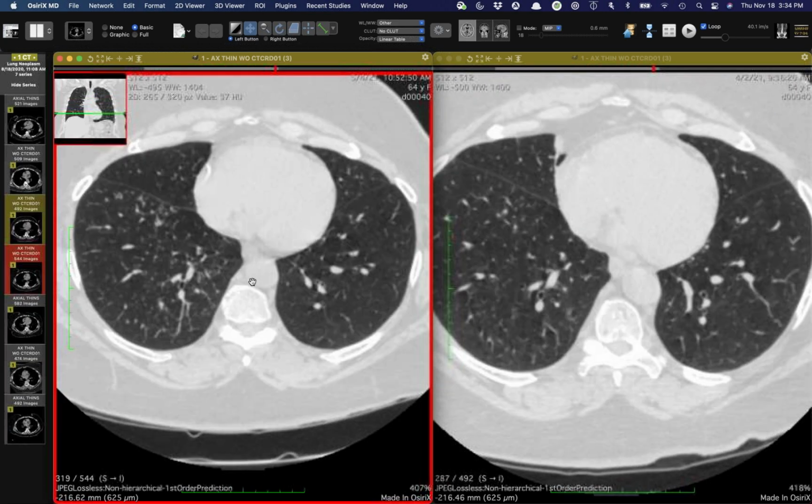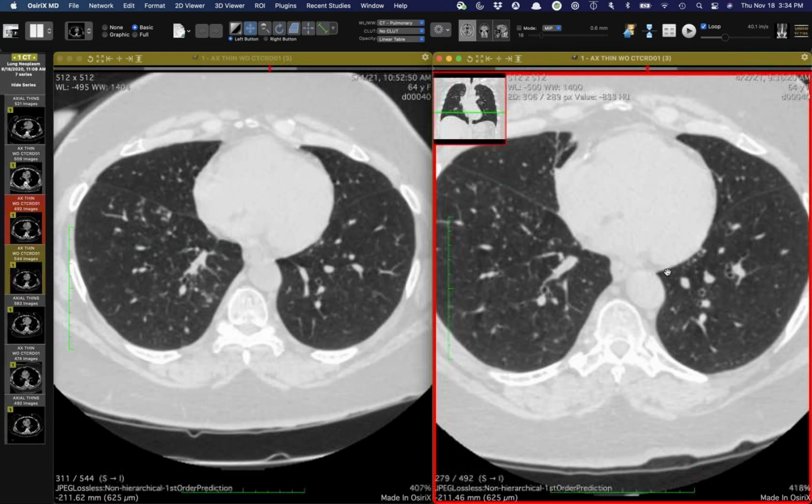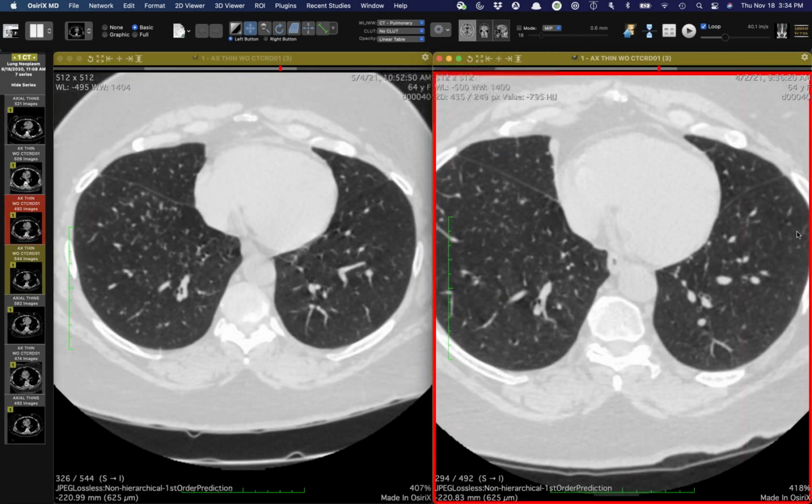That's interesting because I had the same case probably earlier today, but I'll have to go back and review it. It was exactly this. It was a patient with lung cancer with all of a sudden numerous new punctate nodules, which I assumed were Mets, but I'm going to have to reconsider now. Especially when it's asymmetric like this, it's Mets until proven otherwise, and sarcoid reaction certainly up there too. I was thinking it didn't make any sense for miliary disease, so miliary infection. So I thought it was Mets, but I'll have to look at it again. That was my clinical conundrum for the week. That is really odd.